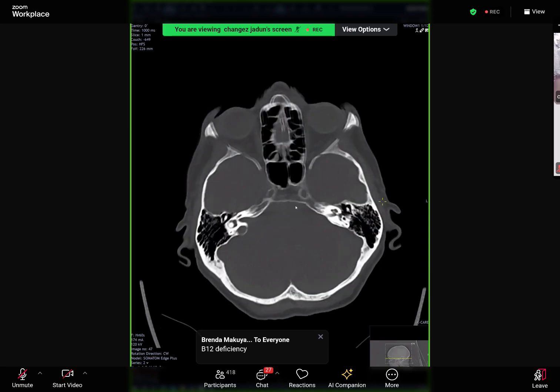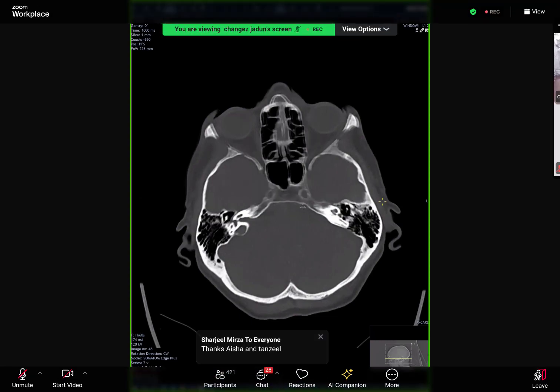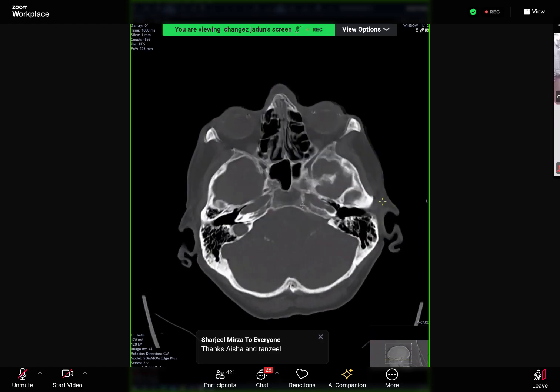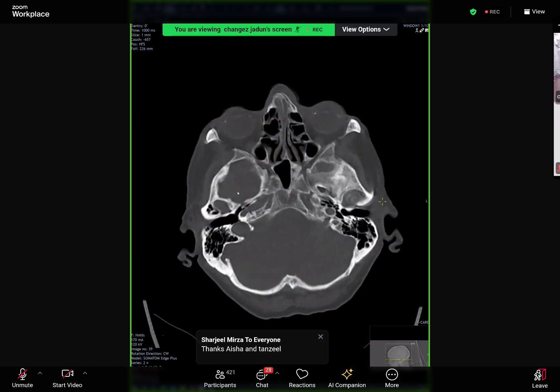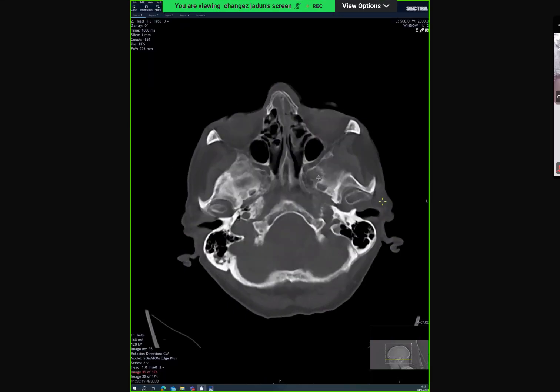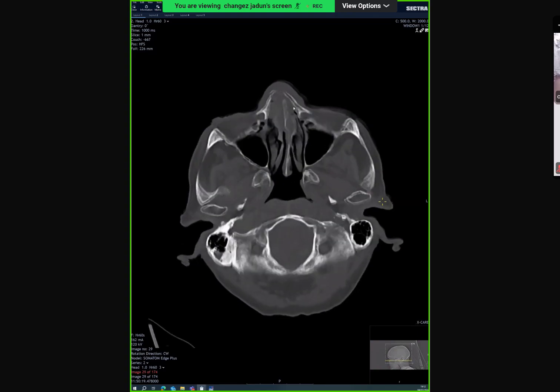So you are telling the examiner what you are looking at, because the examiner does not know what your brain is thinking. So then I would say I'm looking at the front, the ethmoid and sphenoid sinuses. So I'm just concentrating on the front half of the calvarium. So I'll say here I can see movement artifact of the nasal bones. I can't figure out whether there is a fracture or not.